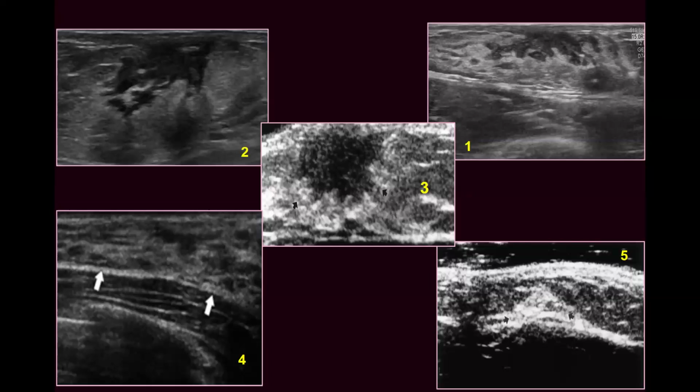But usually we are talking about the whole disc. Which one is larger, 1 or 2? Larger in 1. Yes, but there are variations. That is why I brought multiple examples to show you there are a lot of variations. But at the end, there is one principle: the whole disc. In 1, there is no central hypoechoic core within the hyperechoic parenchyma or rudimentary tissue. This is hyperechogenicity, rudimentary tissue behind the nipple that is small and ill-defined, with no significant hypoechogenicity associated. Okay, this is 1.